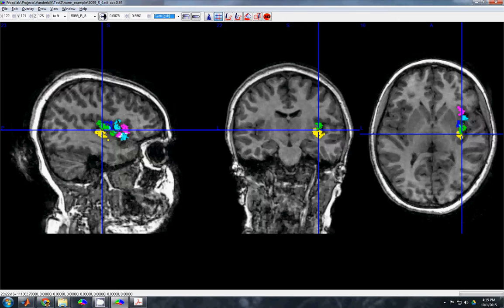So I think that about concludes the training video. Now it's up to you to try things. It'll probably take you the better part of an hour the first time you do one of these things. I really suggest you do use the 3D tool, even if it's annoying to use at the start, because if you start trying to just draw on each slice, it will take much longer. And with practice, I think you'll be able to breeze through one of these brains in about 15 to 20 minutes. So just for this first stage of training, take your time, try to get it right, and then we'll work on speed after we've got accuracy.